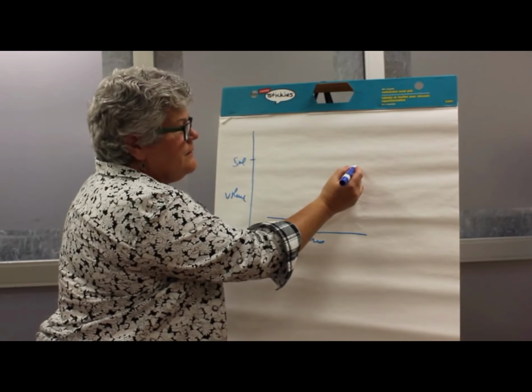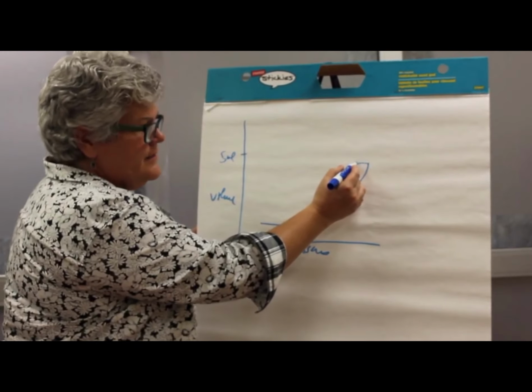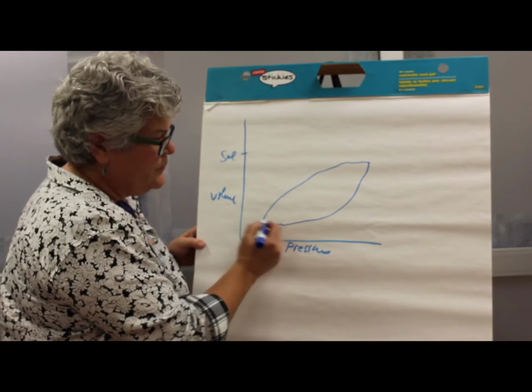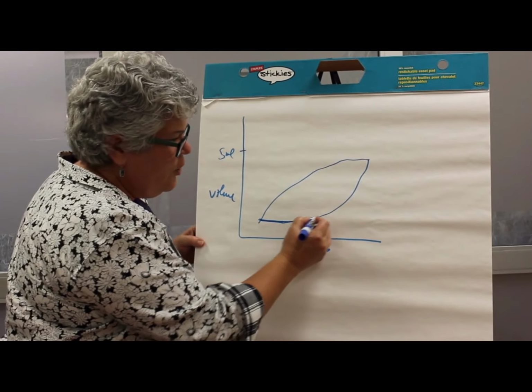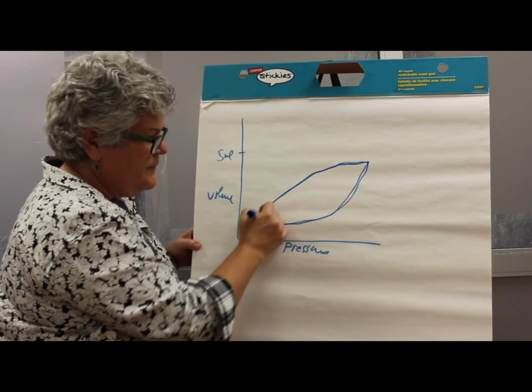And then as the lung relaxes, because the lung is elastic, it has good compliance, the volume stays up, even as the pressure drops, until it reaches a point and then it comes back down. Start over. So this is a very nice pressure volume graph. Pressure goes up, opens up the lung, we reach the end of our inspiratory phase, nice elastic lung, comes back down.